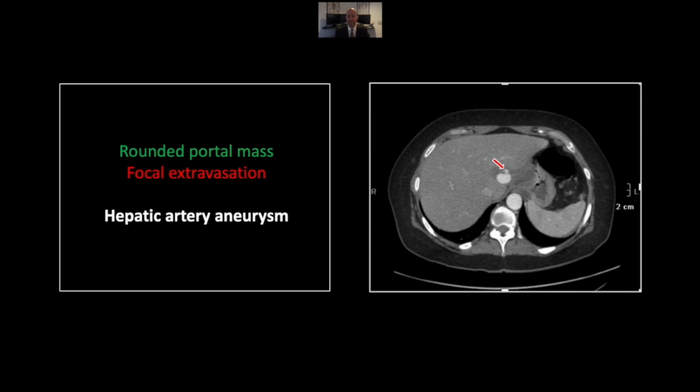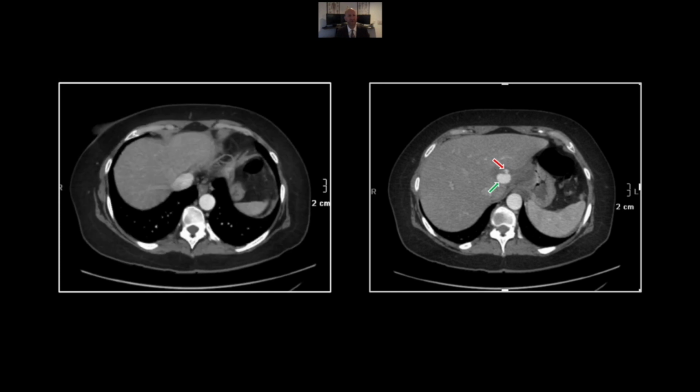that. Hepatic artery aneurysms can be very tricky. They can present with hyperbilirubinemia due to their location in the porta, and they typically are small and difficult to identify. They're not common enough to be on everyone's routine search pattern. So I've seen a number of these go undiagnosed. Obviously, in this case with acute rupture, it's a somewhat more straightforward diagnosis.